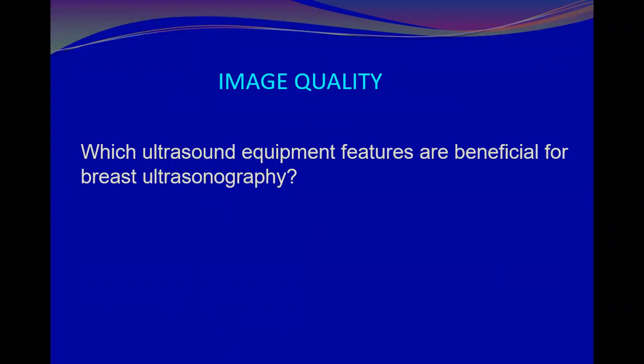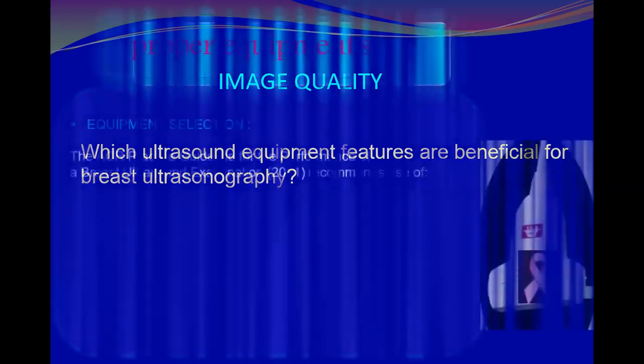first of all, to have good image quality, we'll start from the machine selection. Which ultrasound equipment features are beneficial for breast ultrasonography? Okay.